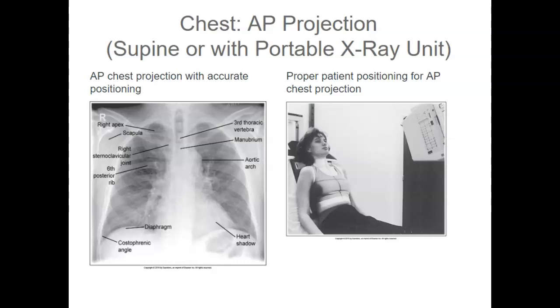1 inch of the apical lung field should be demonstrated above the clavicles. Posterior ribs are demonstrated with a superior bowed contour. The mandible should not be demonstrated within the exposure field. The clavicles should be demonstrated on the same horizontal plane. The scapula should be located and demonstrated outside of the lung field when possible.